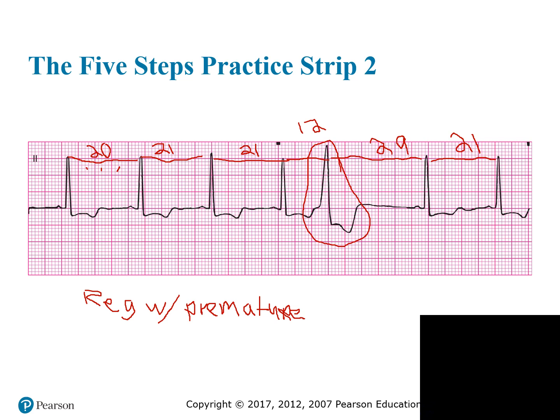Okay, so we determine regularity as regular with a premature beat.